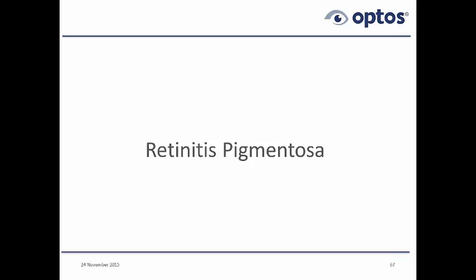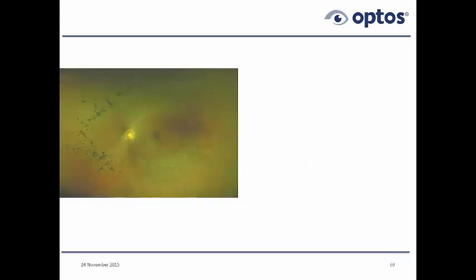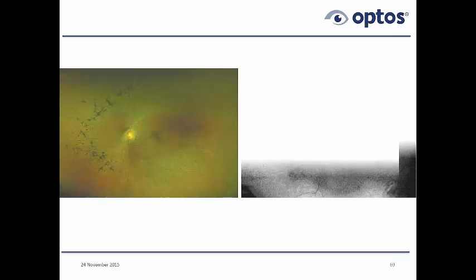Another case of retinitis pigmentosa, and I personally have seen probably 100 of these over the last 4 or 5 years. This one was just published in September 2015 out of Australia. If we look at the standard image shown here, you can see most of this is in the mid-periphery, which is fairly typical. As we can see, this pigmentary change, hence the name retinitis pigmentosa. But you can have RP without any pigment whatsoever.